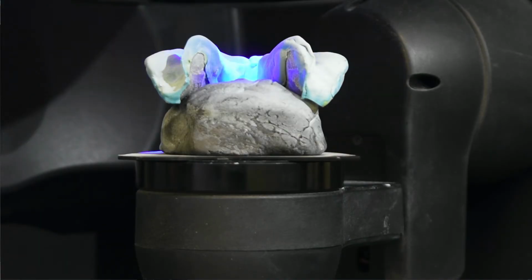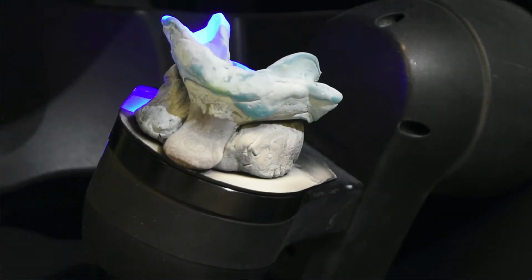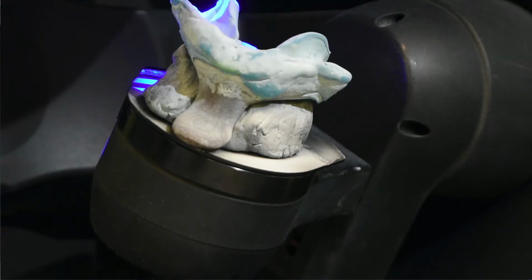You don't have to click and wait. If you click all the spots, it will follow you. It'll keep filling them in wherever you clicked.